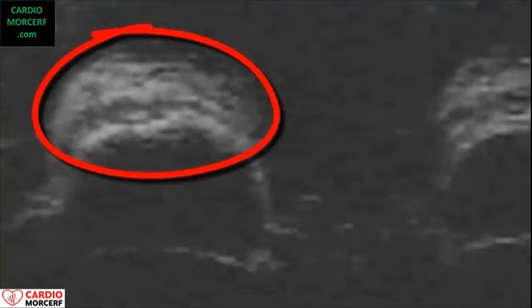See also the torn paper sign. Look at the mitral valve, the anterior and posterior leaflet. Notice this vegetation attached to the anterior leaflet. No lines typical of calcium, but a smudge and a ragged, torn paper appearance of a vegetation.